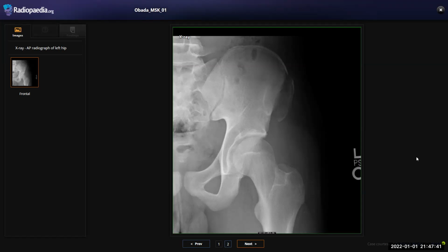What apophysis are you talking about? This is anterior superior iliac spine epiphysis, and I think sartorius is attached to this epiphysis. I can't remember the exact muscle, but it needs urgent orthopedic referral for further management and pinning of this detached epiphysis, which can also cause the detachment of the attachments to it. Okay. How about the iliac crest? Yes, there is some detached bony fragment. It is a bit bigger than only involving the anterior superior iliac spine. It is also involving the iliac crest. Okay. Do you know what muscles attach to the iliac crest? I think rectus femoris.